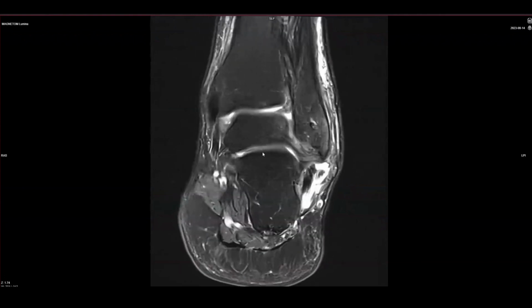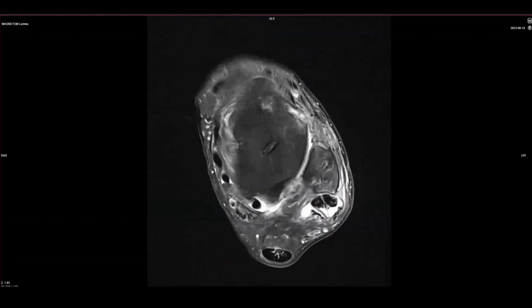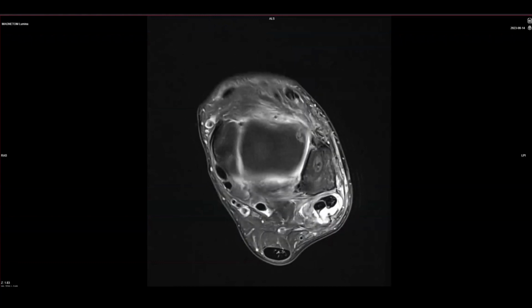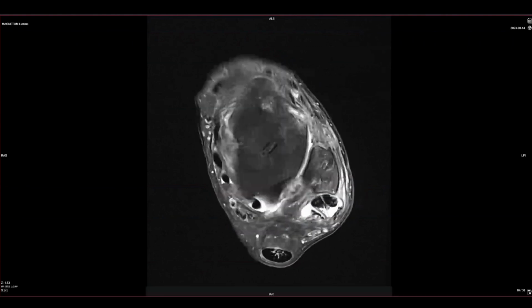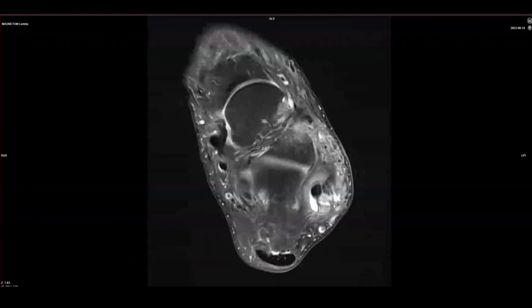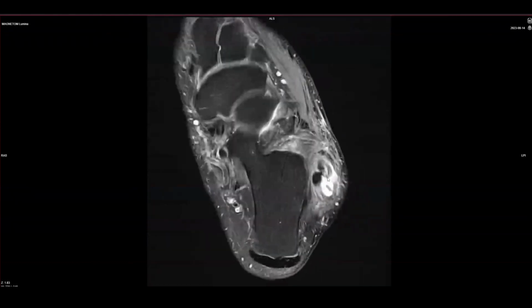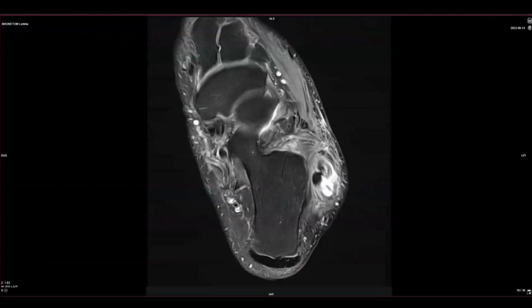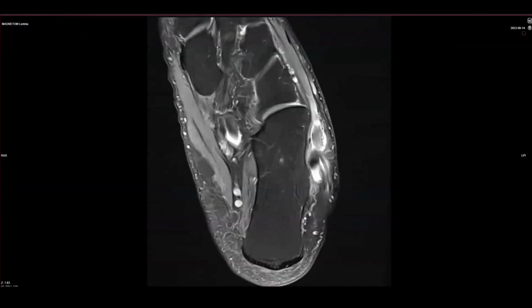Now, I always like to look at my images axially. So when I do that, right away I see the superior peroneal retinaculum is lax and wavy, and there's even a pouch formed here and a lot of synovitis in the region. We see that the tubularized brevis has a thickened appearance, almost that there's more tendon here. So I see this part of the tendon has torn, and this is now circular around. This is a greater than 50% tendon tear.